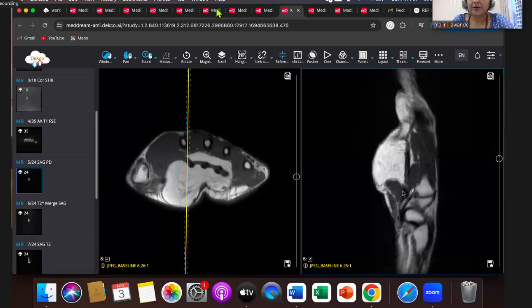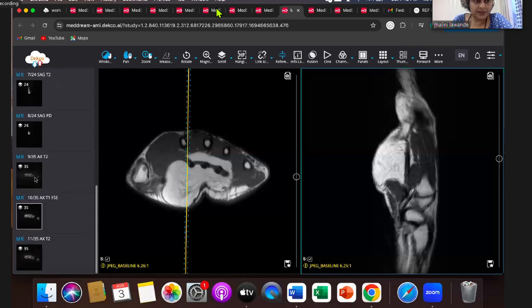Yeah. So what do we think it is? Okay. We are having some answers. Many are thinking lipoma. Some are thinking median nerve fibrolipomatous hamartoma. Some are thinking infiltrating atypical lipomatous tumor. And then whether we want contrast in this patient. Okay, so let's answer all of these.